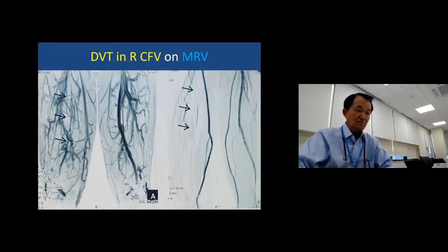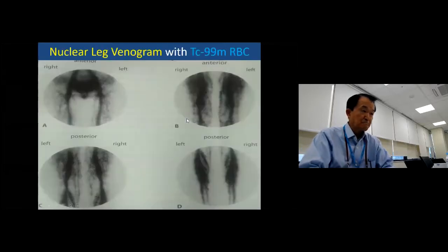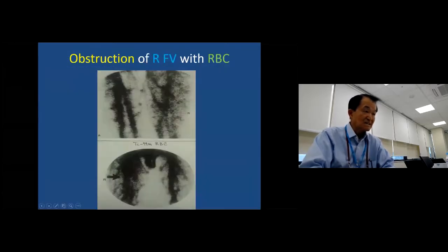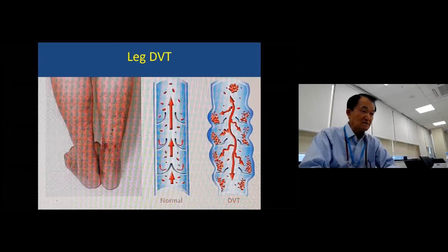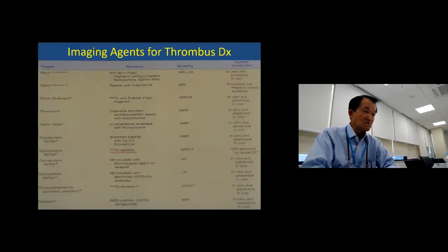This is the superficial chain. The knee is right here. So this is superficial, and this is a deep femoral. Yeah, you don't see it here. This is all collaterals, right side. So here again, with the red cell study, it's not easy, but any asymmetry you have to look at. If there's an asymmetry or lots of collaterals, you can suspect obstruction, but that's not the best. Okay, again, all swelling, varicose vein, I showed you.